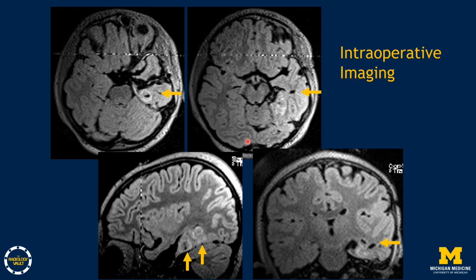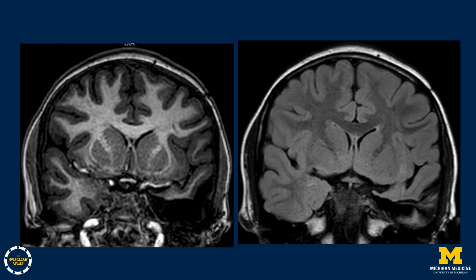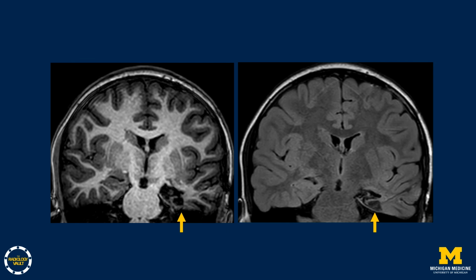Two ablation approaches were used in this patient. Here is a view of the single probe in one of the ablation targets. A subsequent MRI used a routine brain protocol and revealed the changes from the initial surgery, and that's what was reported. I sent the patient back for a dedicated protocol to show the following. So again, anteriorly, the defect from the left temporal lobectomy is seen on these images. Slightly more posteriorly, you see the defect in the hippocampus, but you see also this target site of the first ablation.